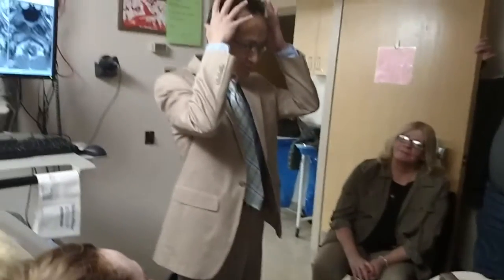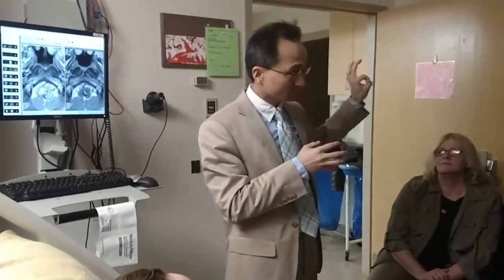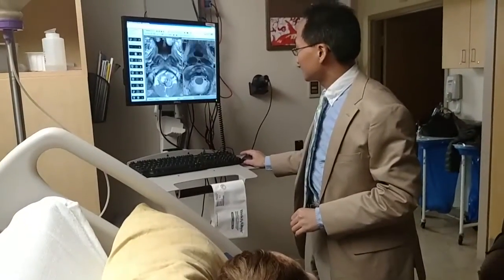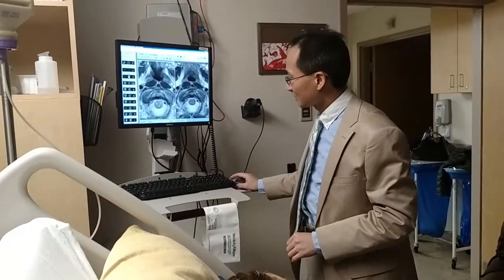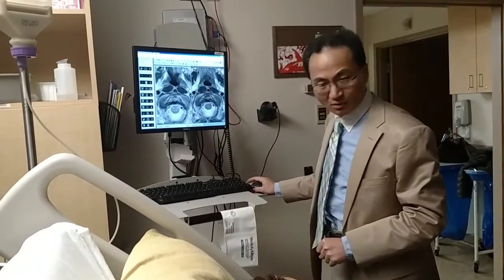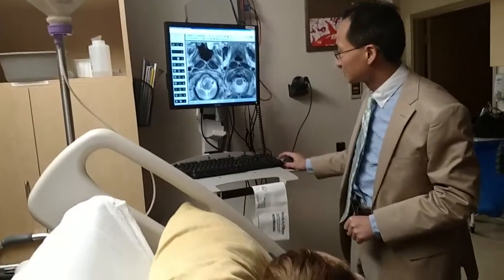Now, we're not talking about just the sensation. Everything the brain does has to go through the brainstem, which is about this big. This is the spinal cord right here. You have swelling down to the spinal cord. That was a lot more just a couple weeks ago. That's all swelling.